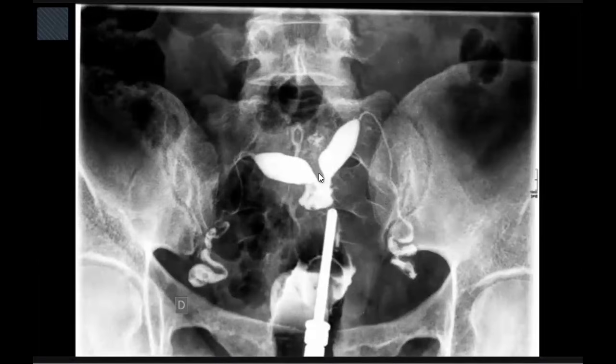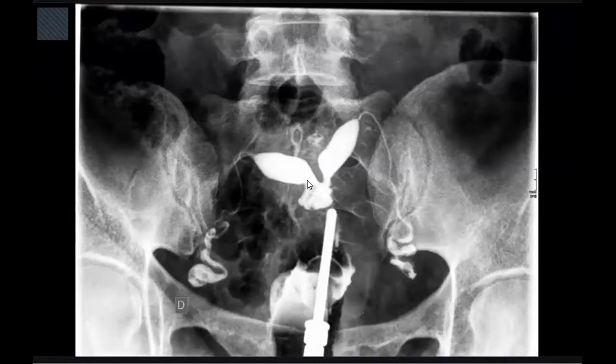There are two uterine cavities which are widely apart from each other, and there is a dip within both the uterine cavities that is deeper than 1.5 centimeter. And so I'm suspecting that this is more likely a septate or bicornuate uterus.